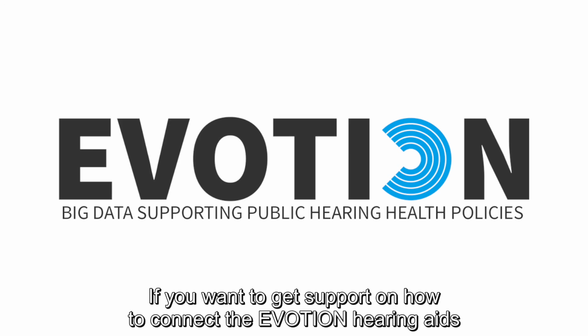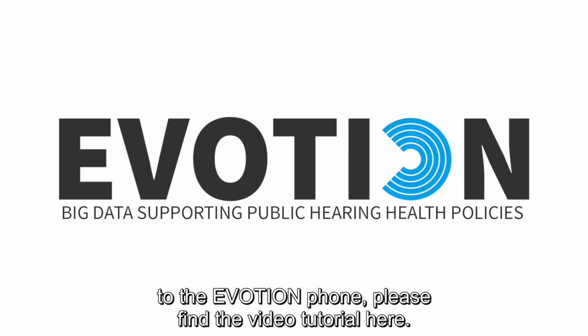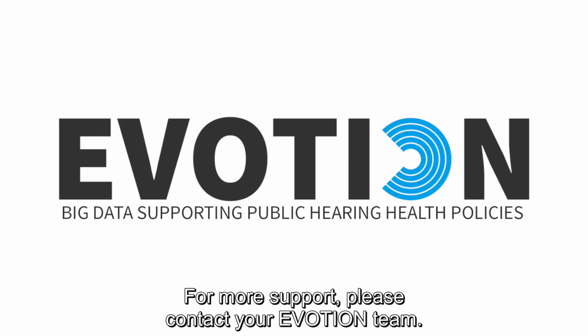If you want to get support on how to connect the EVOTION hearing aids to the EVOTION phone, please find the video tutorial here. For more support, please contact your EVOTION team.